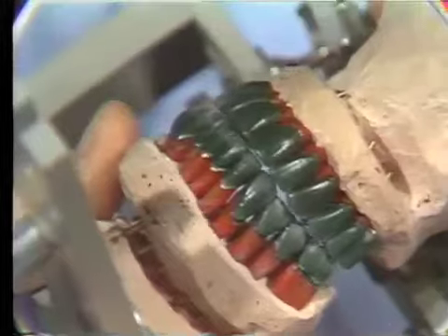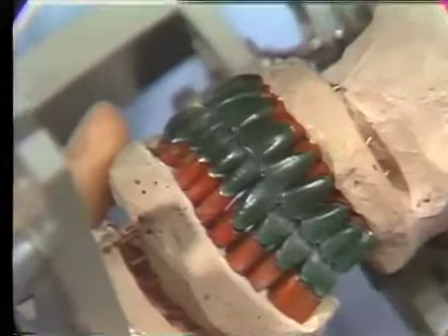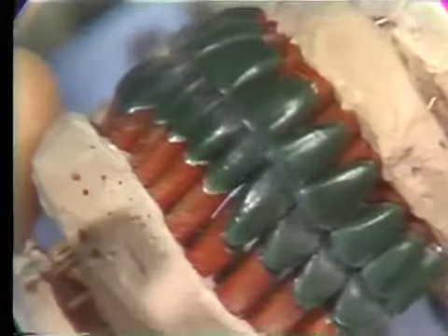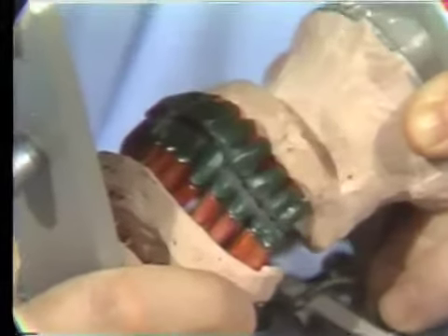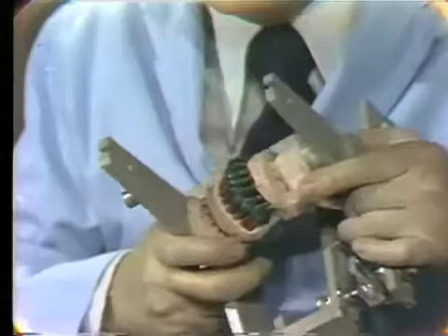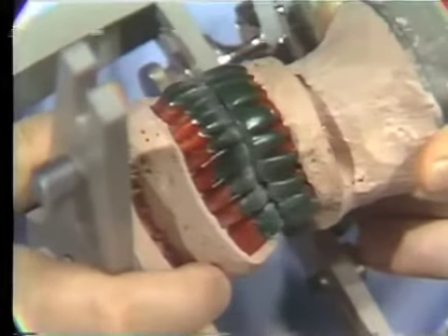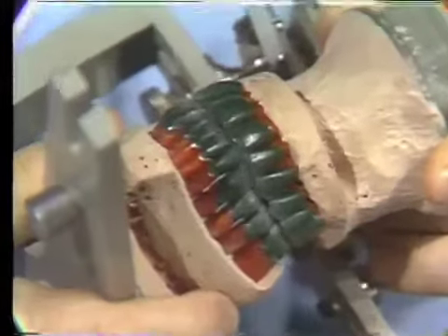In protrusive, we'd want a number of anterior teeth in contact. Again, this is in wax. This will be carved away, but this will give us an idea of the guidance that we would have. Make sure that we have these stops or ledges on the anterior teeth, as you can see here. These ledges, stops on the anterior teeth. Now the guidance in the protrusive movement is very uneven here, but then again this will be corrected when we go to have the porcelain baked on the anterior teeth. So the guidance looks about right at this stage.